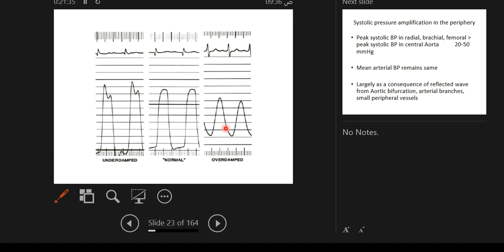A damped pressure: if you have bubbles in your system, whether the bubble is in the catheter or in the tubings or at the manifold, all these are areas where bubbles like to stay. And so you will get a pressure like that. You say, what's going on? So you withdraw your blood and then you do a proper flush and you have a fluid-filled catheter again, and this pressure changes to become a normal pressure like that.